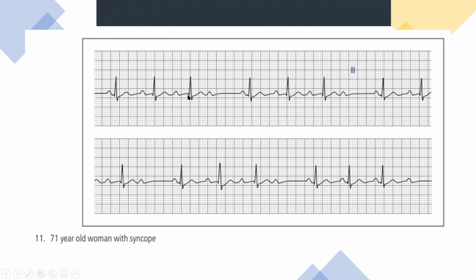So that's when you start getting this. And then eventually you start getting the point where the wave is not conducted at all. And then again, it starts getting conducted in this way as well. Now, the truth is that the majority of these patients will develop symptoms such as syncope, palpitations. If they start getting into a tachyarrhythmia and things like that, they can eventually progress to Mobitz type 2 and complete heart block. So that's where the issue comes about. And sometimes they do need the electrophysiologist to have a look at them and see what's going on. So like I say, the PR interval that's slowly lengthening, that's what you're looking for in a Mobitz type 1. So this is what we have here.